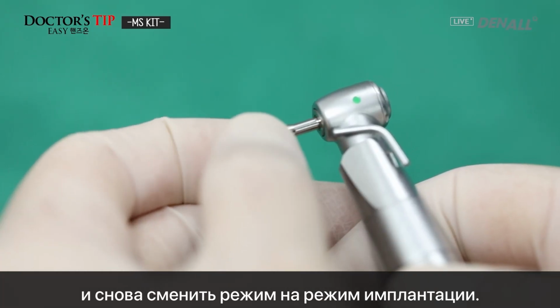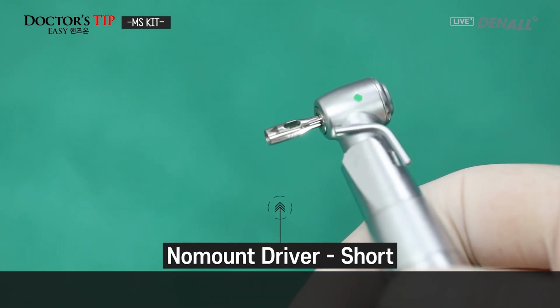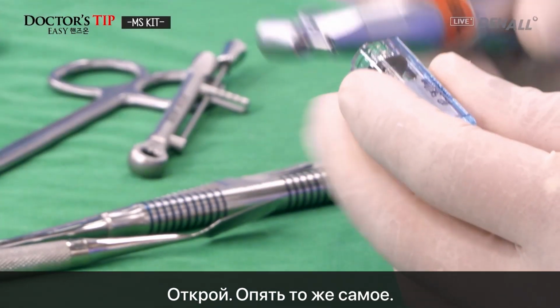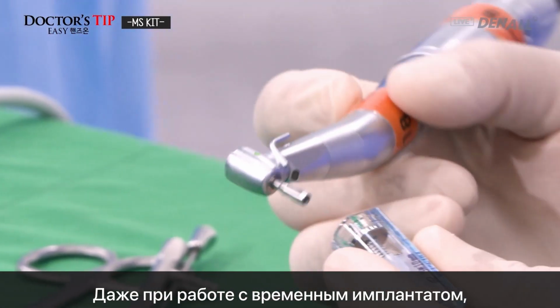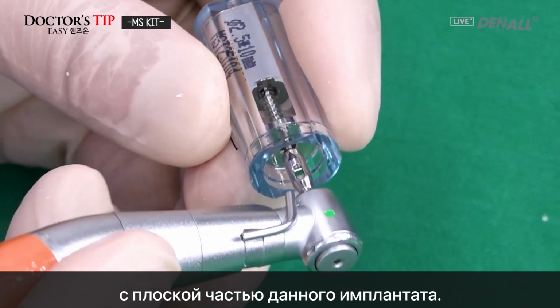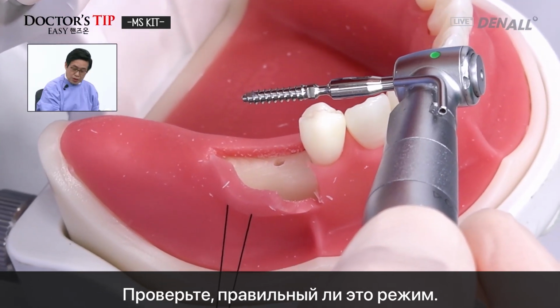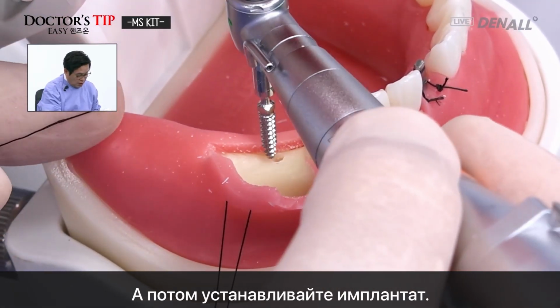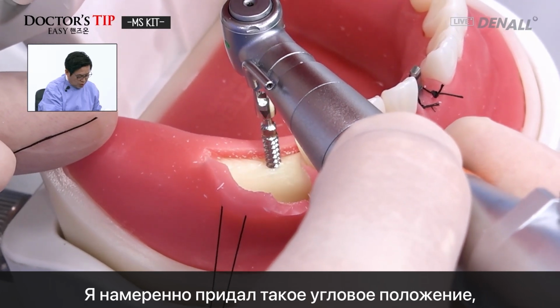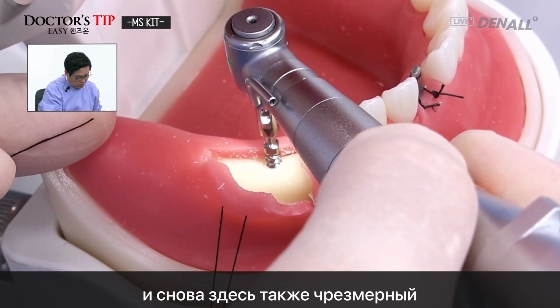And again, change the mode for placement. Open it. Same again. Even if it's provisional, the marked area connects to the flat area of the fixture. And check the mode, whether it's the correct mode, and then place. I intentionally, as I said, gave the angled position, like this.